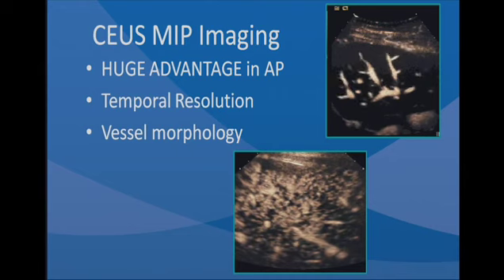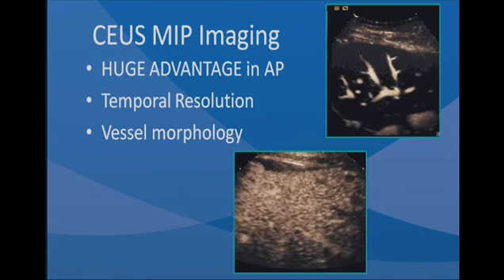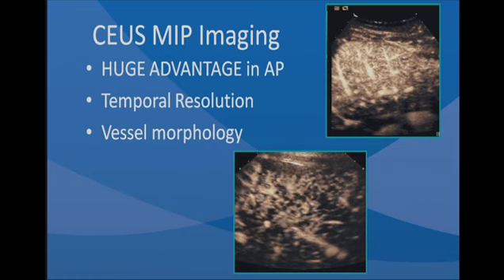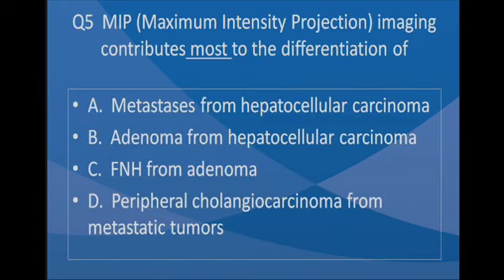So here you can see on the top right image that we're looking at a normal liver with beautiful arborization of the vessels, and on the bottom left, we're looking at a patient with cirrhosis with marked truncation and tortuosity of these abnormal vessels. And so only on ultrasound can we see this exquisite resolution, where here in a patient with a hemangioma, we can see the normal vasculature with resolution up to the 6-order branches of the liver vasculature.